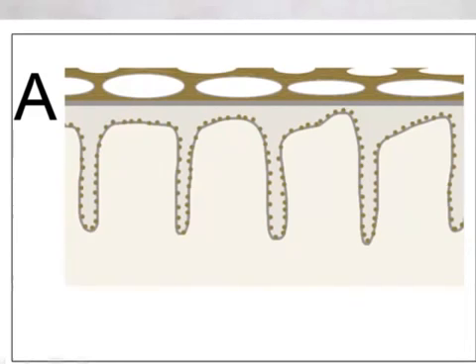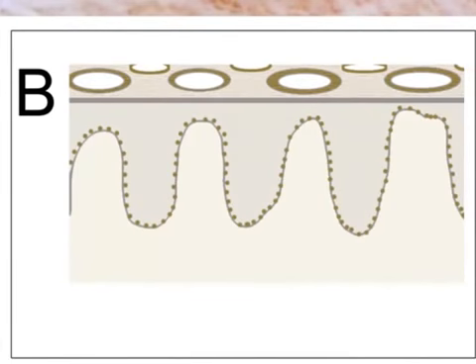If the dermal papillae are narrow and the rete ridges are broad, which happens in acanthosis of the epidermis, like here on the right side, you see on non-facial skin circles, like in this dermatofibroma. Here at the periphery you see pigmented circles. There is acanthosis in dermatofibroma.